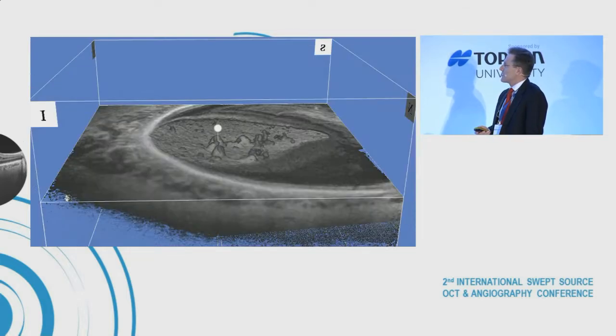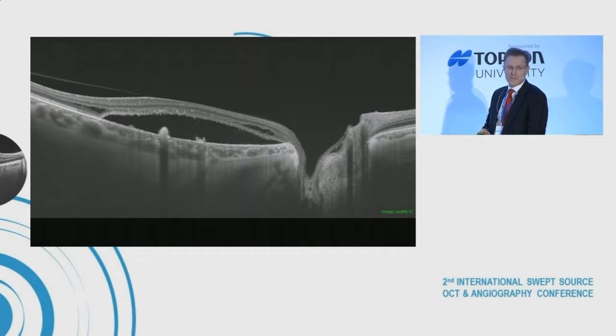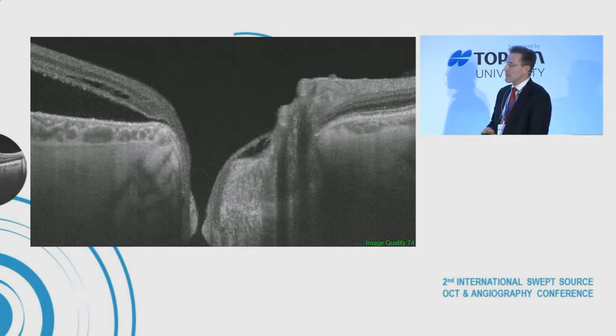And let's look into the cave here. Here we have taken the lid off, and you see Stonehenge under the macula, and this is the roof, and here is the chronic serous detachment, and the strange debris may be pigment epithelium proliferation underneath it. Then what's the cause of all of this? Let's look down into the optic nerve head, and surely enough, we have an optic pit, as many of you already noticed on the first slide. So here's a connection from the cerebrospinal fluid up to the vitreous and down onto the retina.